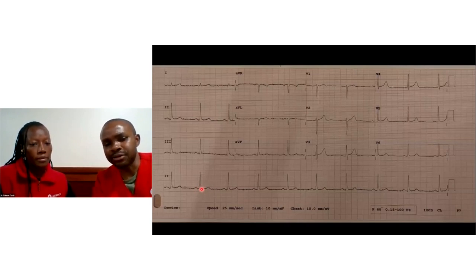And finally, we have the ST segment, which is during when the ventricles are also contracting, the ST segment, which is right here. And then finally, we have the T wave, which represents the ventricular repolarization. So I've seen someone asking on the chat. And then afterwards, we now finally have the resting phase, and then the cycle repeats again.